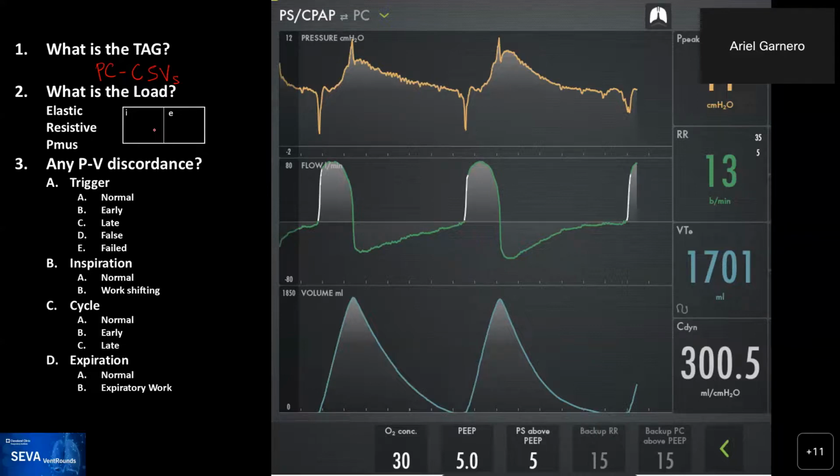And we knew that the mode had to be pressure support. The point is now how much assistance would be able to prevent a huge work from the patient, and at the same time, not encourage on top of the pleural pressure a higher level of positive pressure. This vent doesn't have automatic tube compensation, but I had cases like this before that I ended up ventilating with CPAP and automatic tube compensation only. It was seeing the patient literally taking a huge breath, and we couldn't do anything.